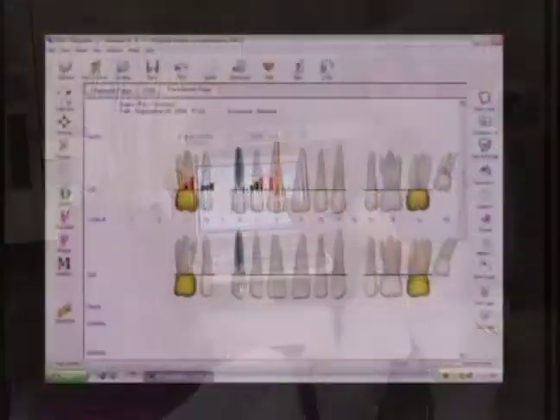Pus. Now I can make, in those options, under the sound options, I can enunciate suppuration, pus, or exudate. You notice I had this one turned on to pus, and I submit that patients understand what that means. If that's the point, let's use language that they understand. Patients don't necessarily understand what suppuration is, so I have mine turned on to pus.